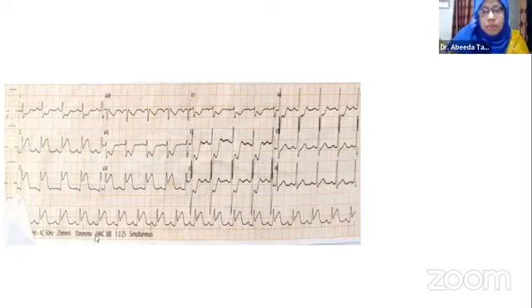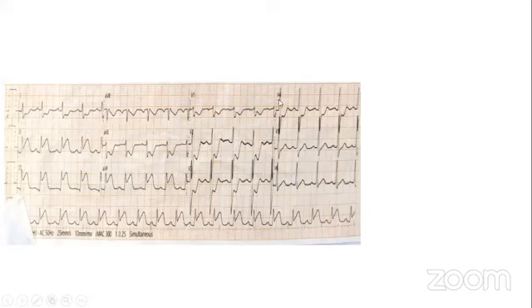Okay, Madhu sir, your comment please. Whenever we are telling an ECG, I would always stick to the first basic thing, the rate and rhythm first. And then I'll go on telling about the other things. Naim is very good in his observation. And I always tell my students, do not look at only the obvious thing. First look at it, then go for the secondary changes. He has described nicely the ST elevation, then the ST depression, then the anterior chest lead changes. This is very nice of him.